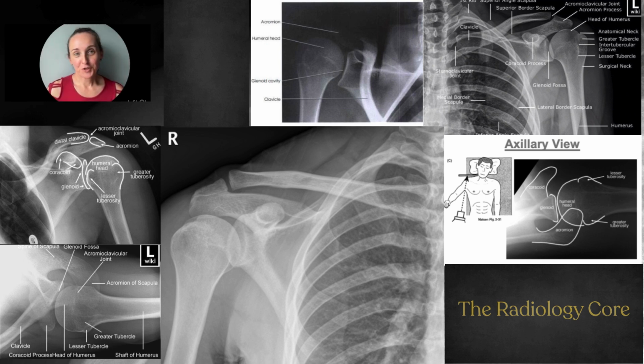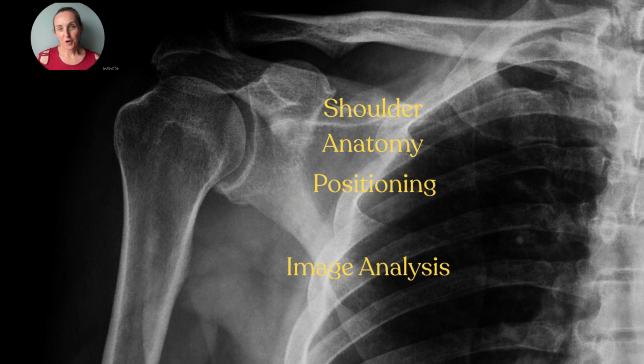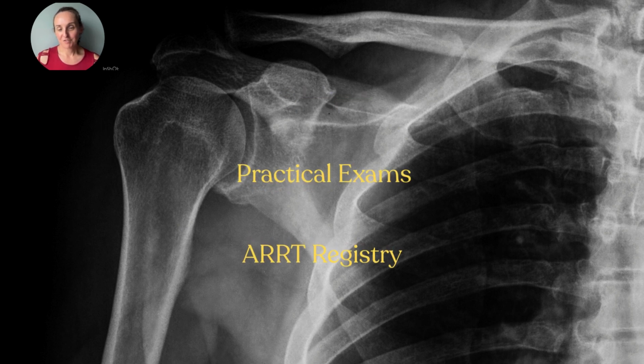If I handed you 6 shoulder x-rays right now and asked you which ones were diagnostic, could you tell me why? As a clinical instructor, that's exactly the skill that I'm looking for. In this video, I'm going to walk you through a systematic approach to shoulder anatomy, positioning, and image analysis that will help you succeed in clinicals, practical exams, and the ARRT registry.